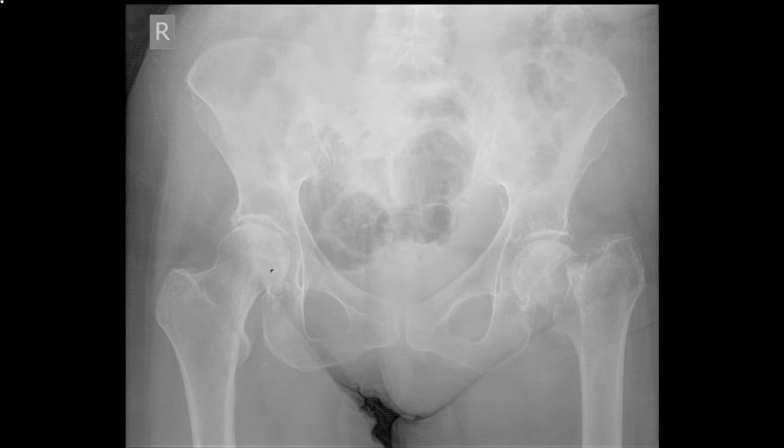It is not quite normal because the degenerative disease within the hip is shown by little sclerosis and osteophyte formation, but the head itself has a normal density. The left head is dense, and this is because of the long-term problem. She fell approximately 2 months before this radiograph was taken, and so this femoral head has now become ischemic. So that is one of the complications of a fractured neck of femur we are trying to avoid by the treatment by orthopaedic surgeons.